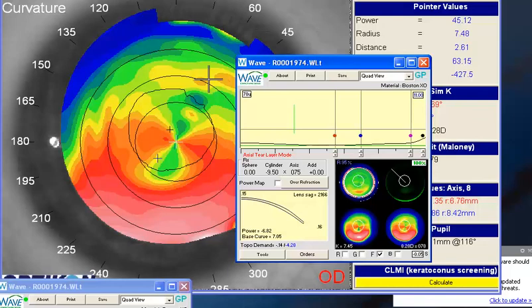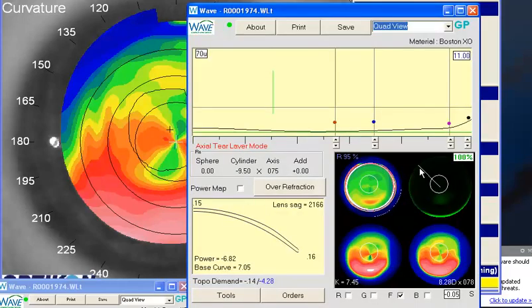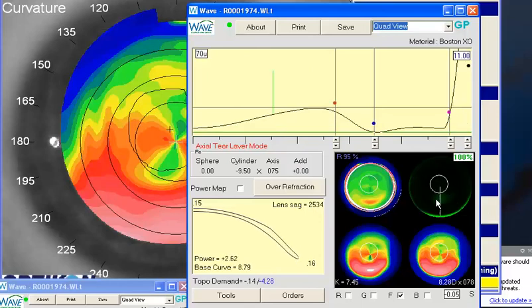I used freeform to try to actually match the shape of that cone on the cornea. And you can see this design actually looks pretty nice. So we come around here, we get some nice alignment in these areas, and rightfully we got some lifting up over those areas, but the back surface of that lens matches very closely to this topography. So I have had good success with some of these patients just not going the semi-scleral route, just going a very large corneal lens. So either way that you choose to go, I think you can be very successful, but you'll probably find yourself doing a little trial and error along the way.